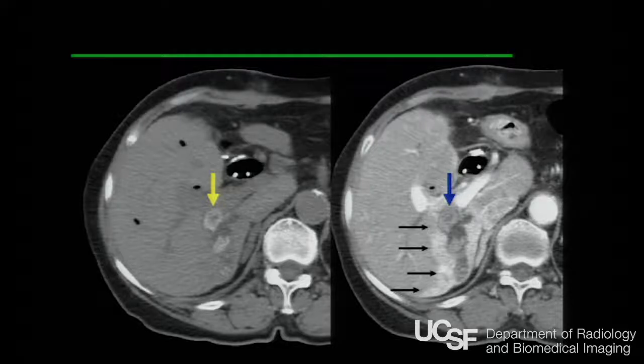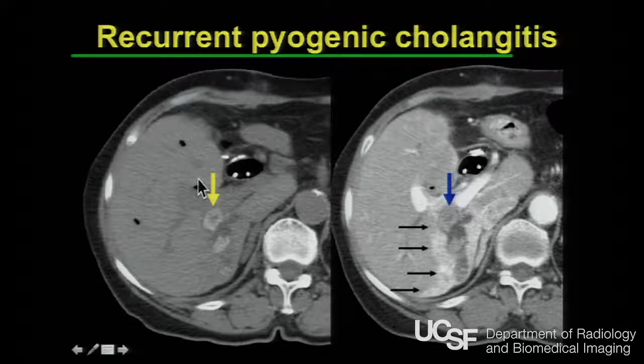Let's put it together. Do you think this is a bile duct obstruction? Well, we see dilated ducts, we see offending mass, these geometric lamellated structures in the dependent portions of the biliary tract. Here's a cluster. These are intrahepatic biliary stones. We see the transient hepatic hyperenhancement during the arterial phase of enhancement. And so we do have acute obstruction of the posterior ducts in this patient. And this patient has large intrahepatic stones. We have pneumobilia in this case. So it's a case of recurrent pyogenic cholangitis.